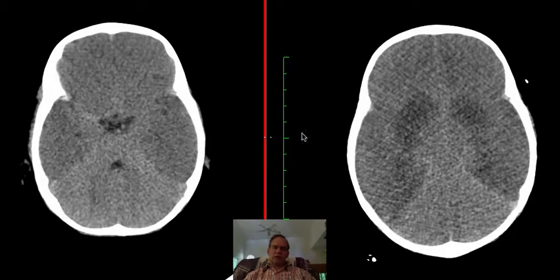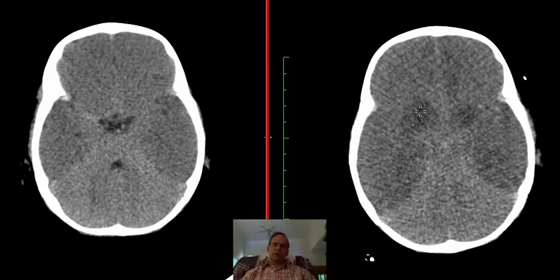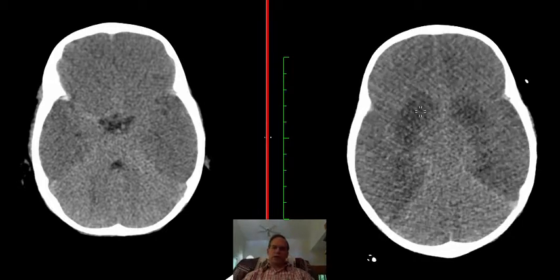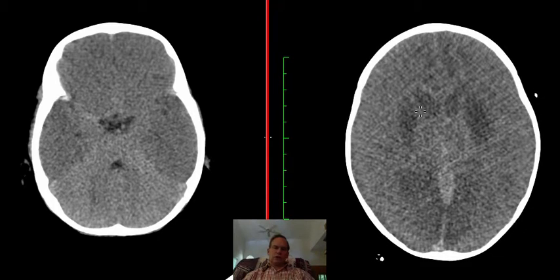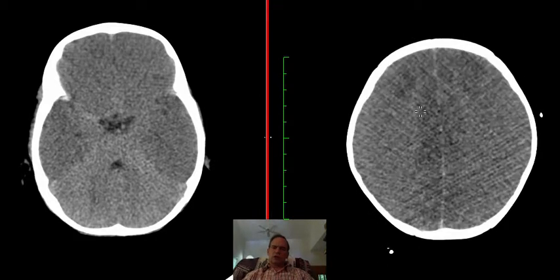So this is a devastating event, and it does not reflect diminished perfusion as we're accustomed to as the etiology of infarctions in the brain, but rather in this case it involves an anoxic event, normal perfusion to the brain, but with a low level of oxygenation.